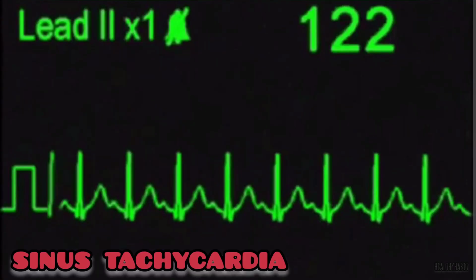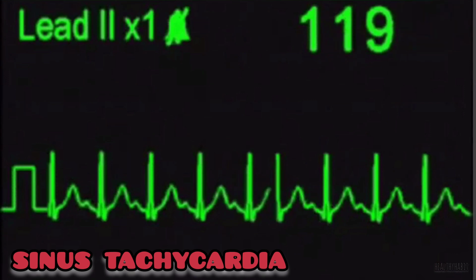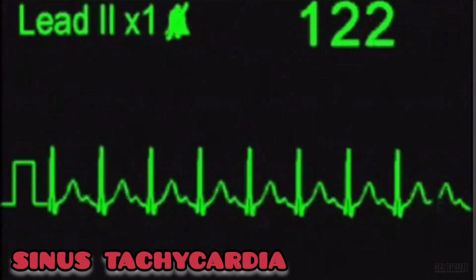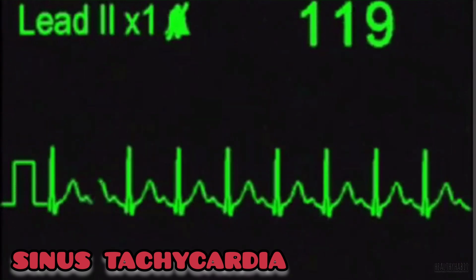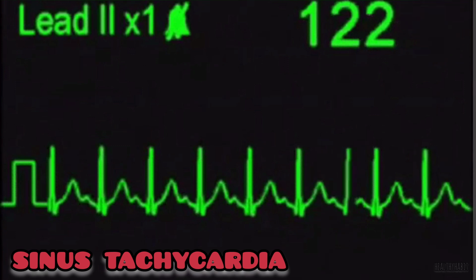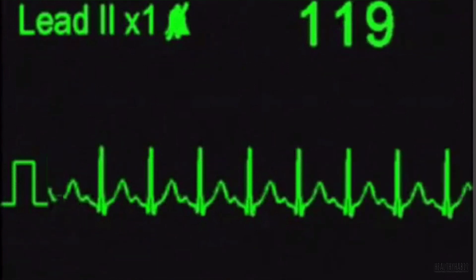Sinus tachycardia is a regular cardiac rhythm in which the heart beats faster than normal. While it is common to have tachycardia as a physiological response to exercise or stress, it causes concern when it occurs at rest.